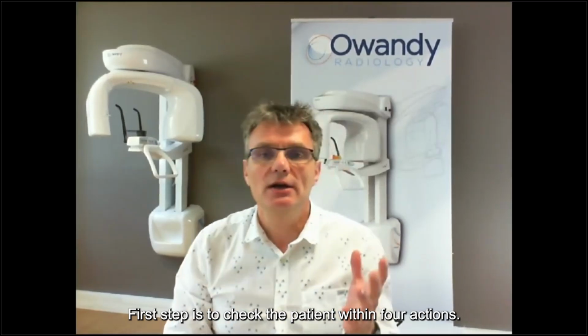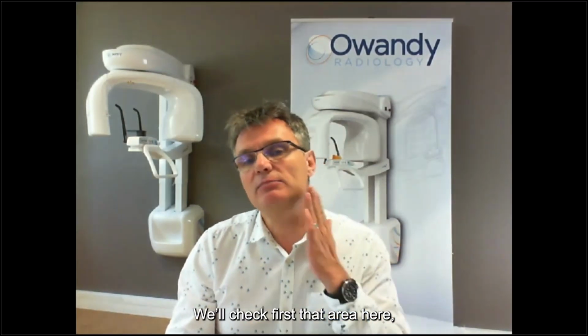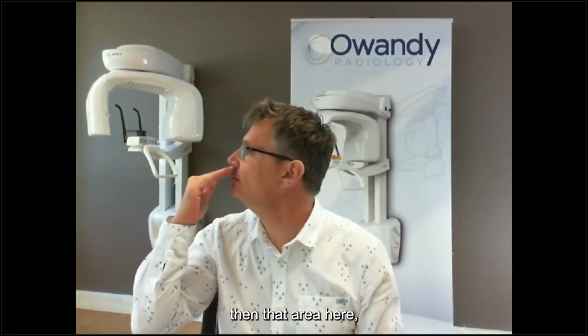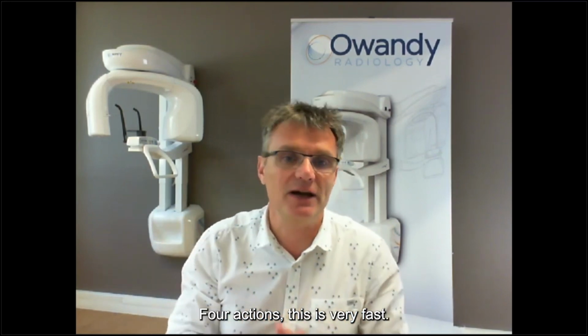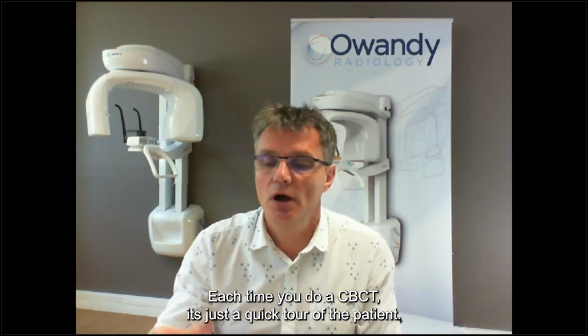First step is to check the patient within 4 actions. Okay, we'll check first this area here, and then that area here, and that area here. 4 actions. This is very fast.